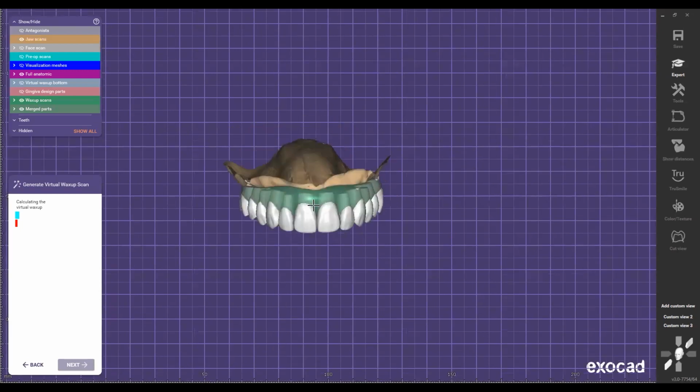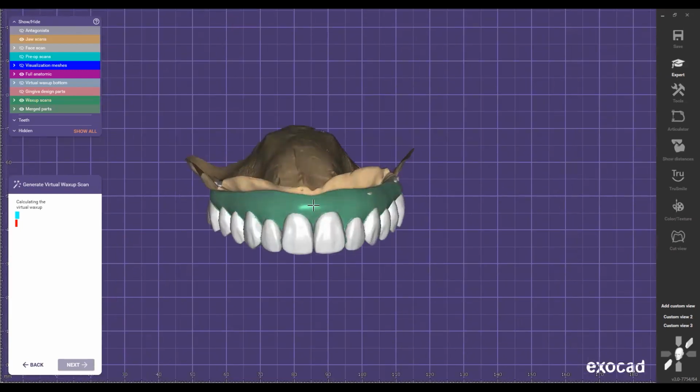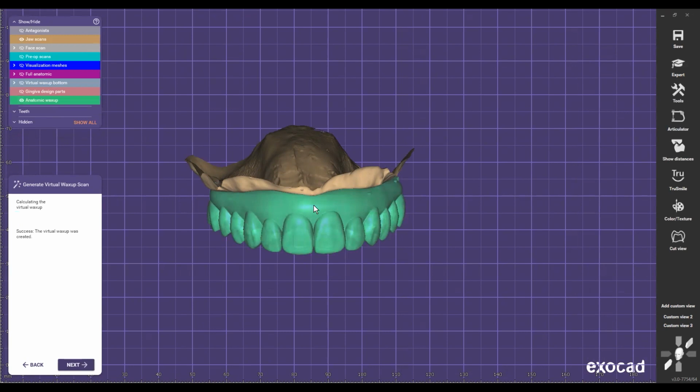Once you start applying these techniques and these ideas, it just makes everything so much easier, especially for these cases, right? Because the goal is to do a nice, beautiful setup and a beautiful smile, not just an okay smile. Because remember, in the U.S., patients are paying from $30,000 to $50,000 an arch. I want to make sure that if I'm paying $30,000 to $50,000 an arch, I get beautiful teeth, right? It's going to be worth it.